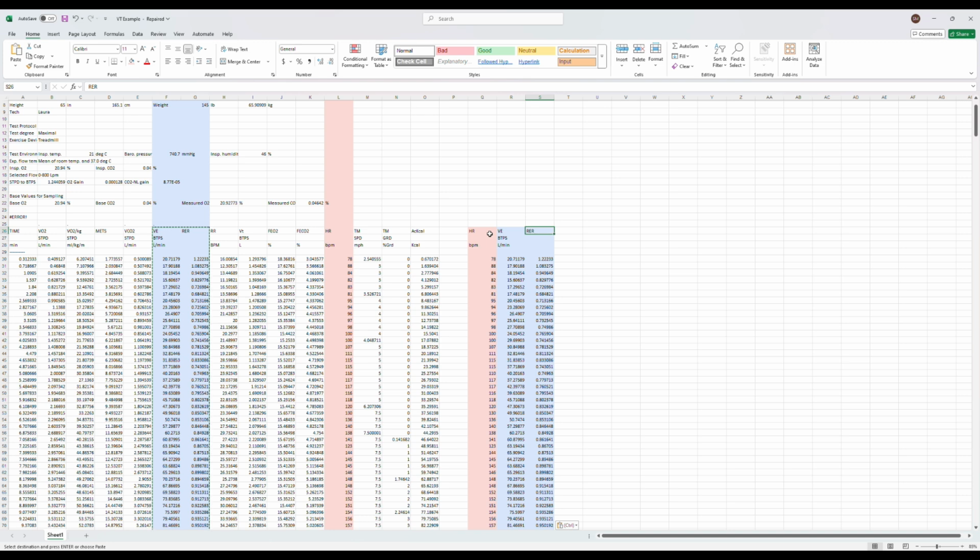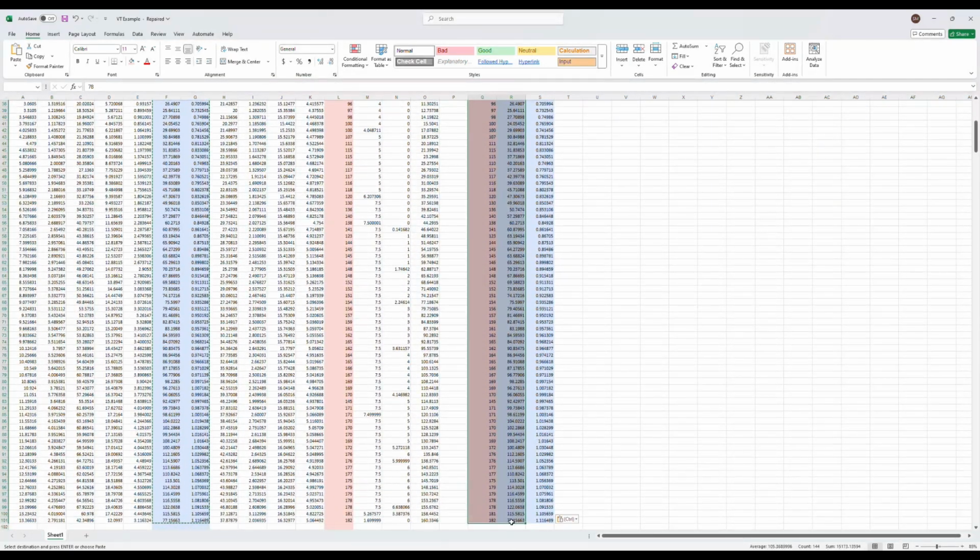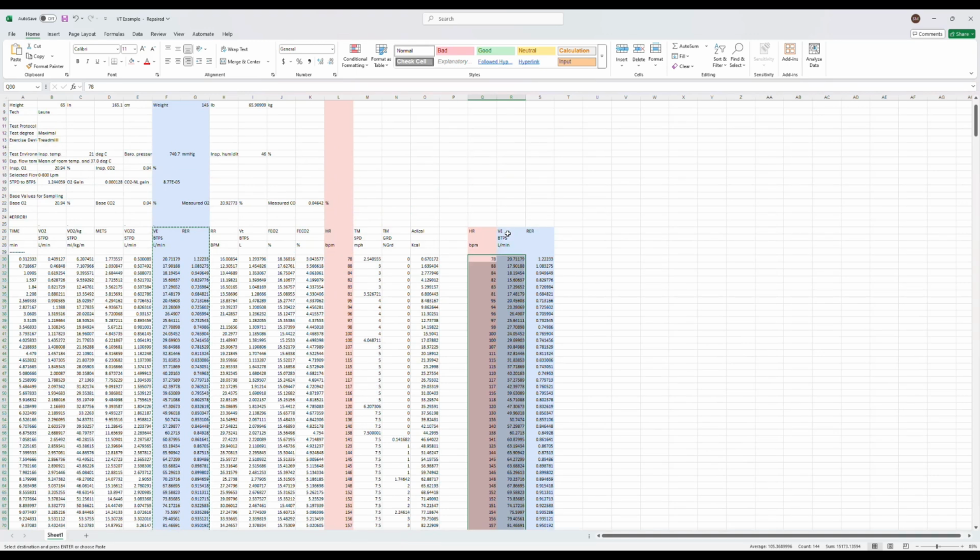So once I've got the data cleaned up a bit, I can see what I'm looking at specifically for this estimation. Then I can go ahead and select all of my values for heart rate and ventilatory exchange. We'll go ahead and graph ventilatory exchange versus heart rate first, and then after this we'll graph respiratory exchange ratio versus heart rate.